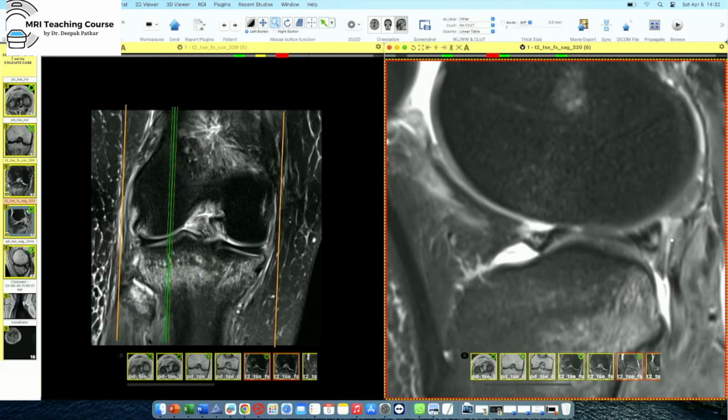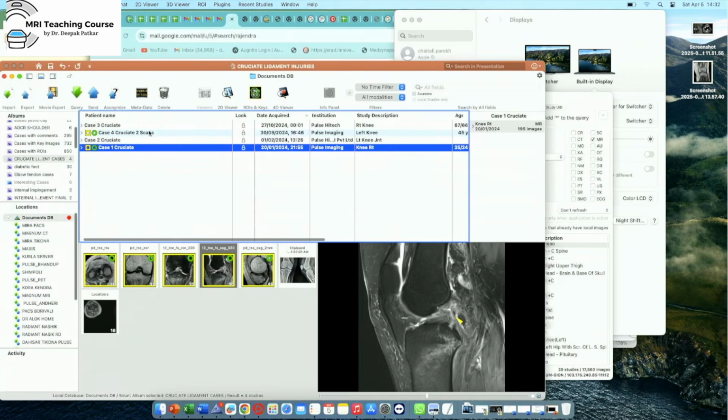All right. So this is a patient with full ACL tear, intermediate grade PCL injury, MCL and LCL injuries, both meniscal tears, posteromedial corner injury, posterolateral corner injury and Segond fracture. Unfortunately, nothing is left of it. Right? So very easy if you know everything. This is the checklist that should run in your mind whenever there is an ACL injury. You have to go through all these things. Okay, so let's look at the second case.